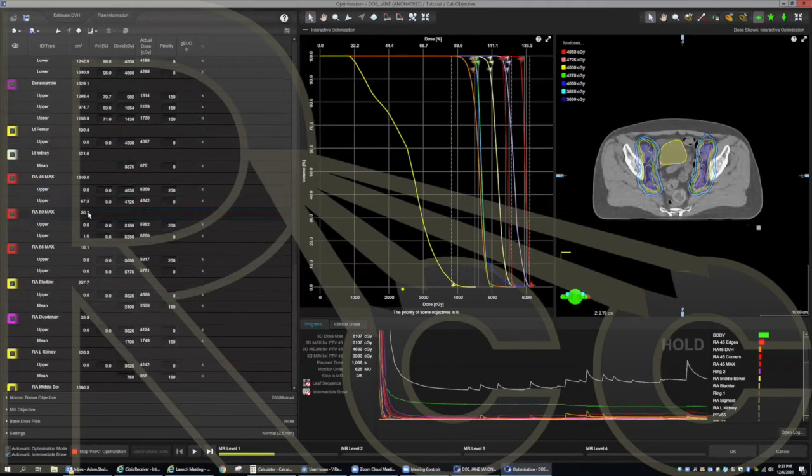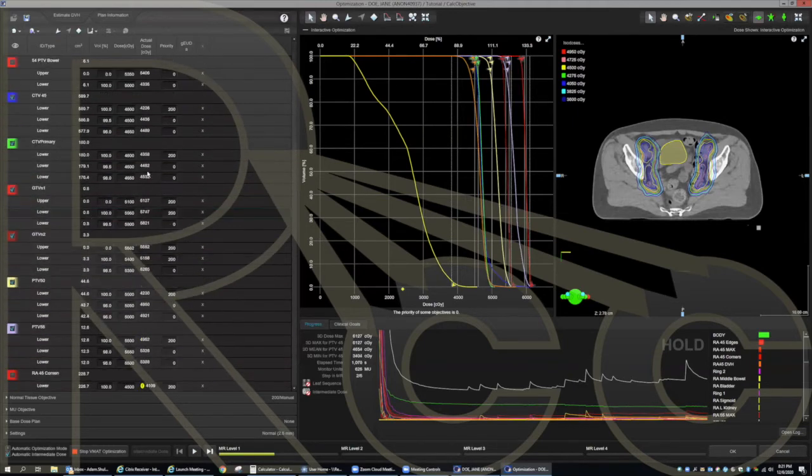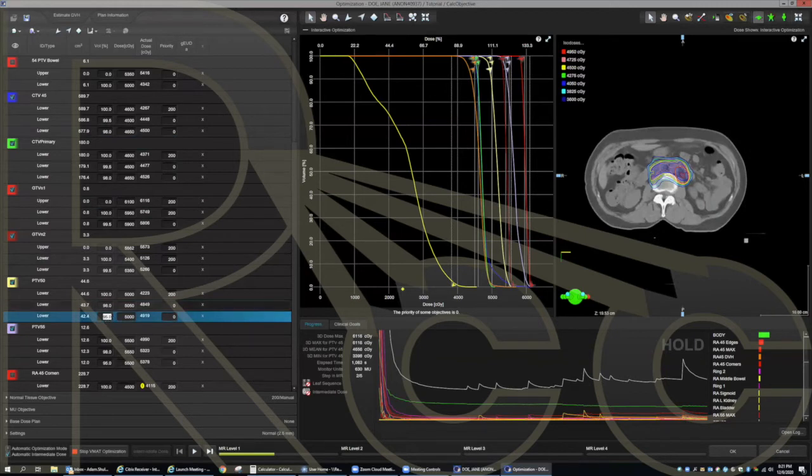While this is optimizing, I'll show you a couple other DVH things I put on here, which I didn't explain before. We'll start with the PTV-50. So I put 95, so my D95, I'll want to be prescription 50 gray. I'll always have it at 0, but it just shows me what it is. If you don't have this value, you can just put D95 50 gray with 0.